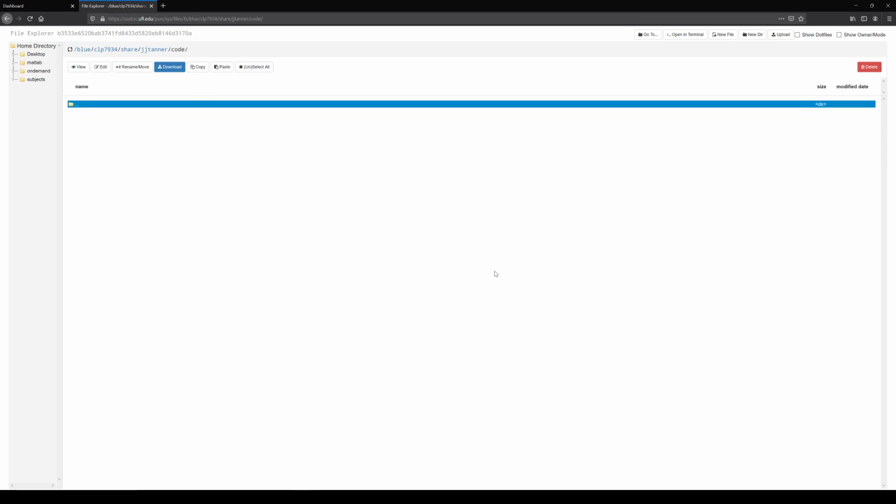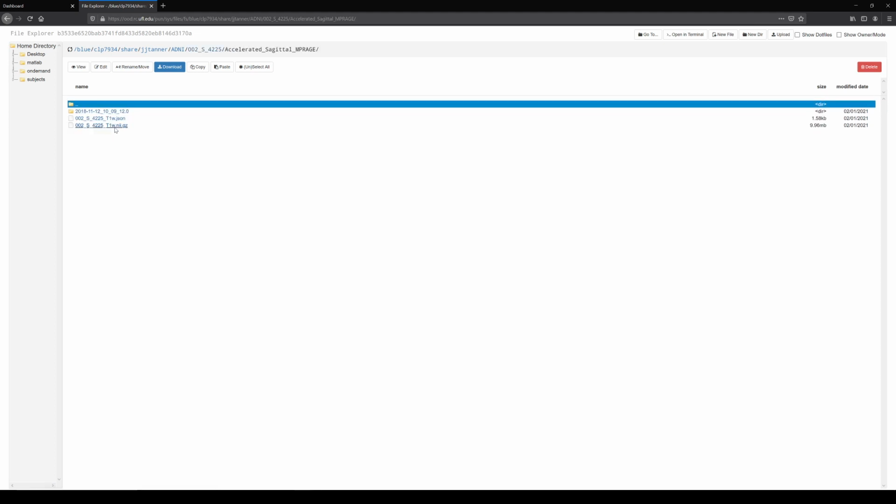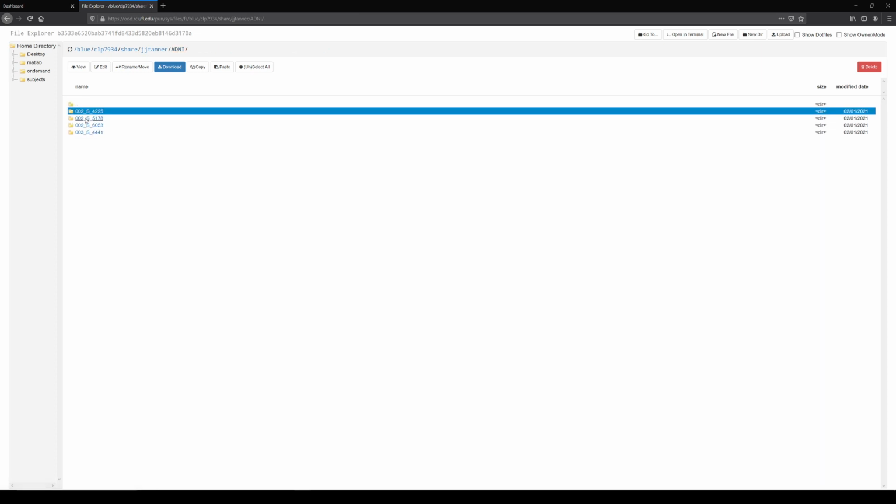But I'm going to write it locally. So in here, add me. We had done, at least I had done, you might have chosen someone else, this 002S4225. We're going to ignore this subject for now. So remember, we had converted their T1 file and had looked at both the DICOM and the NIfTI. I'm going to leave that one alone for now, because we're going to do something with the other 3. You can do something with that person, that's fine. I mean, make that part of your processing, but I'm not going to.